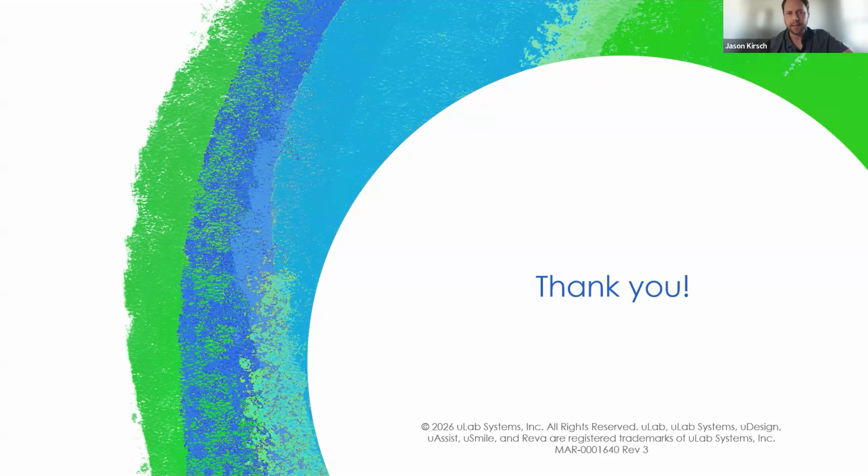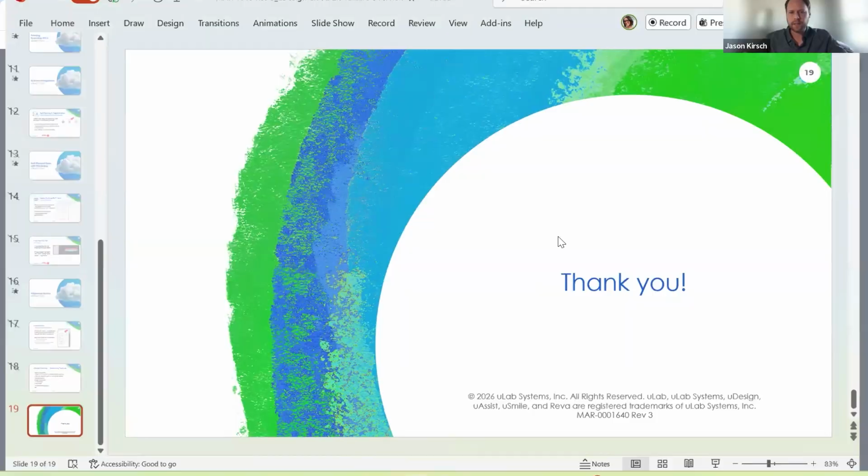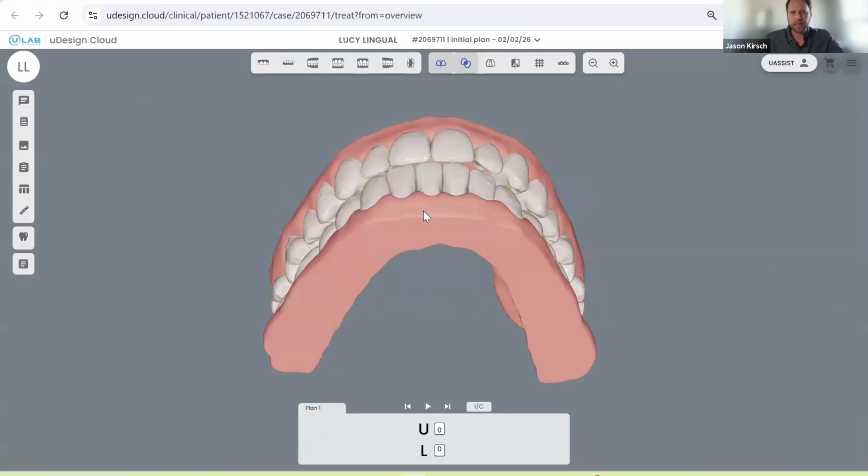You can, yes, that is where you would, yeah, I can show you that. That might be better as a one-off kind of thing, because it may take a minute or two to explain. But you definitely could. It's going to involve playing with the keyframes. Let me show you that real quick.